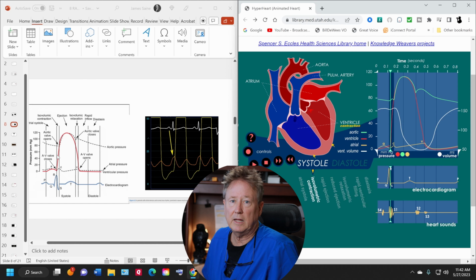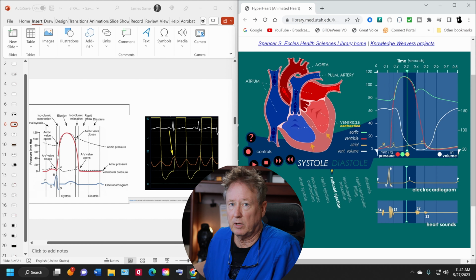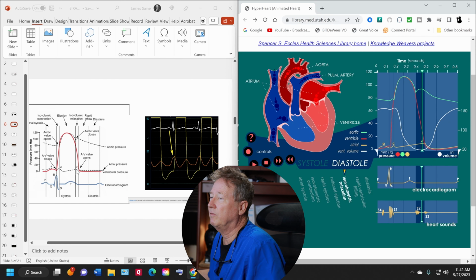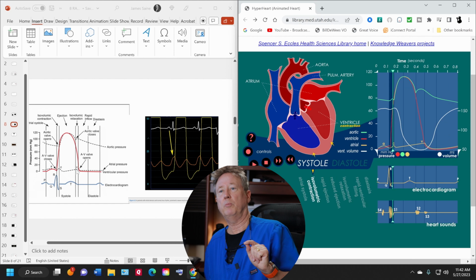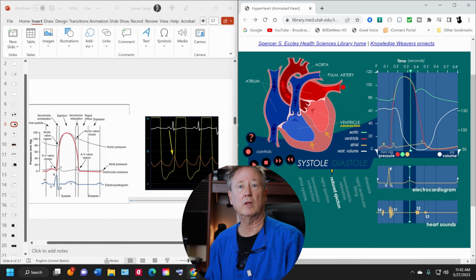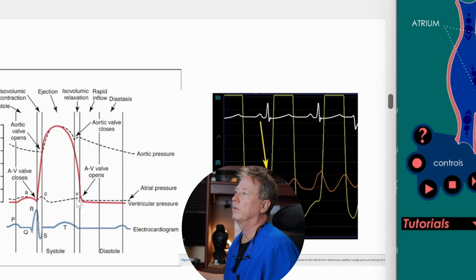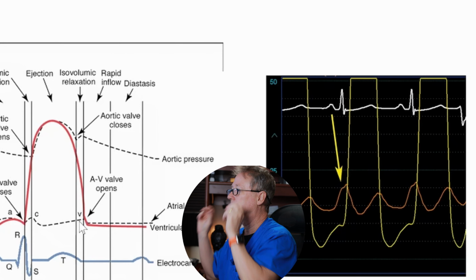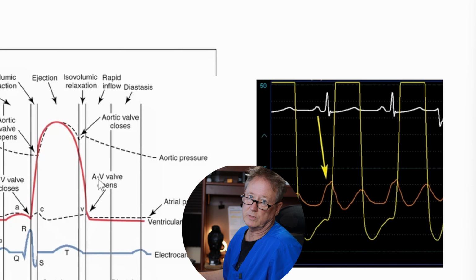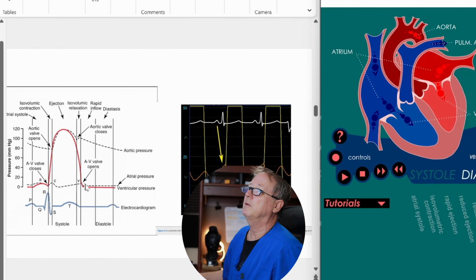So let's go to the beginning of when either the mitral valve or the tricuspid valve opens up, and it is here at the peak of the V wave. So that's when the mitral valve opens. So it's not that we're measuring stenosis during systole only. It's when the valve is open, that's when we're seeing if it sticks. So the key part is right here at the peak of the V wave. That's when the atrioventricular valves, the mitral valve and the tricuspid valve, open, and the blood empties out.